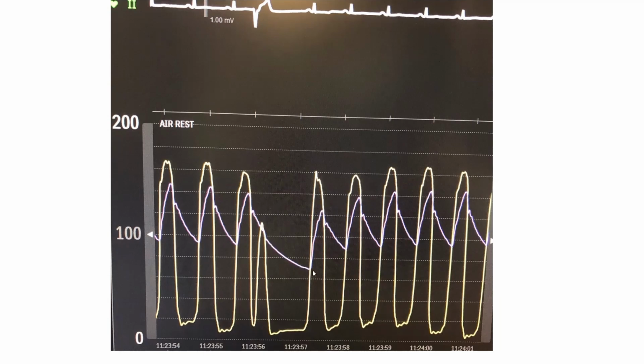And the post-PVC behavior. After the PVC, you have an increase in contractility and preload, and you have an increase in flow. So you get an increase in gradient, because the gradient in valvular disease is flow dependent, as the Gorlin equation attests to. But there is also an increase in stroke volume in the aorta, so you get a wider aortic pulse pressure. You get a higher LV pressure, higher aortic pressure, and higher gradient, but the aortic pressure doesn't drop past it. You got it?